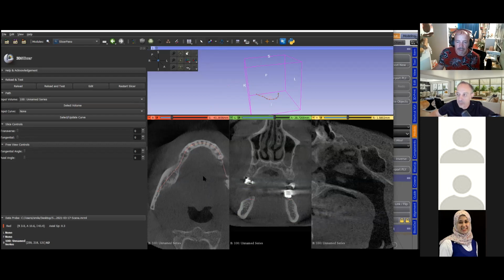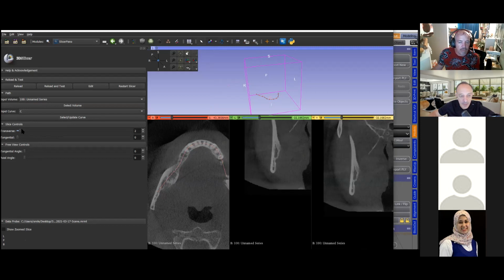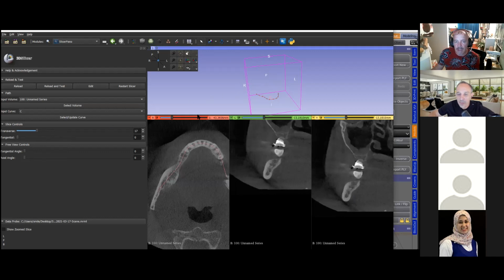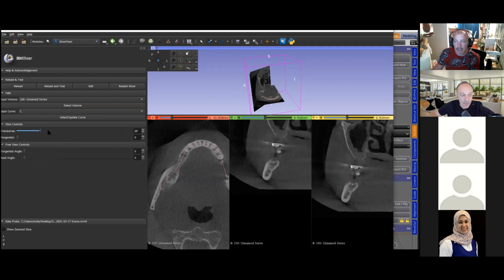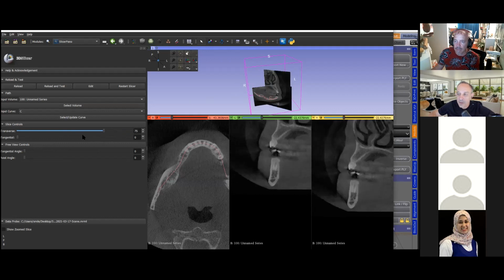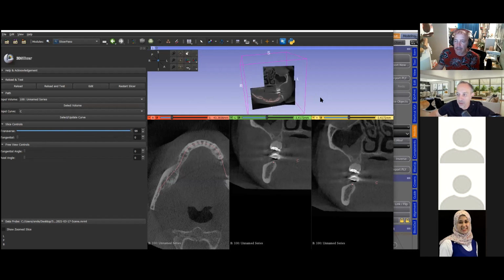The purpose is so that we can actually see through this, the slice will move through it. So I'll show you exactly what I mean. We're going to select the curve, and then as soon as we move the slicer, the slide, it will move along. Now you don't see it over here because we've hidden it, remember? So we'll just open the eye, and here we can see how it moves along the curve. So it's like a perpendicular plane that moves along the line as such.